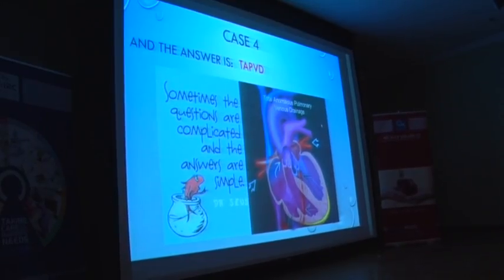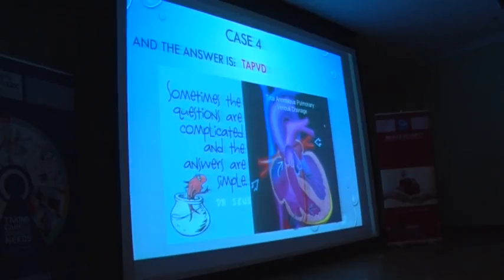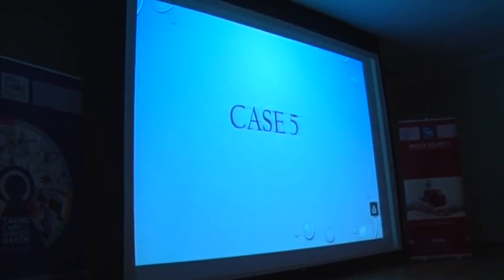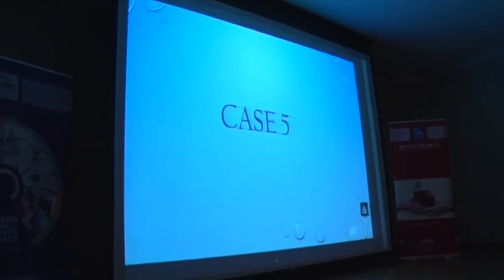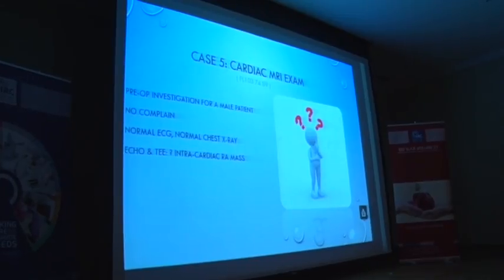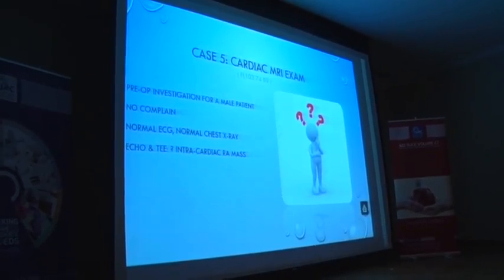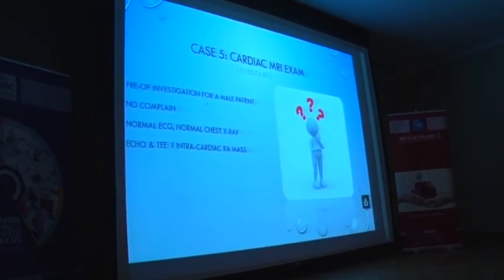And the last case, and it's not CT, just to change a little. So actually, we're thinking of getting a cardiac MRI machine in our new center, hopefully. So I will show you a cardiac MRI and what we can do with an MRI, a full comprehensive cardiac MRI exam. So this was a preoperative investigation for a male patient.